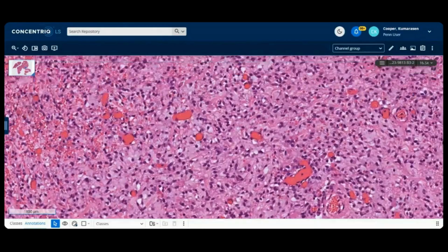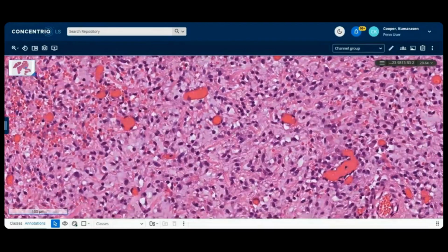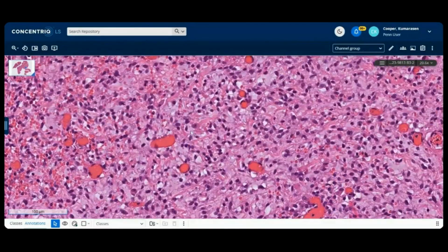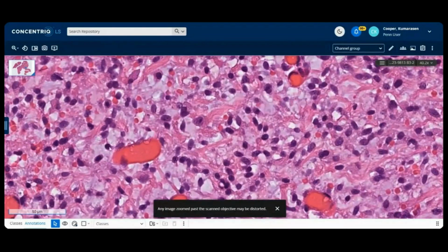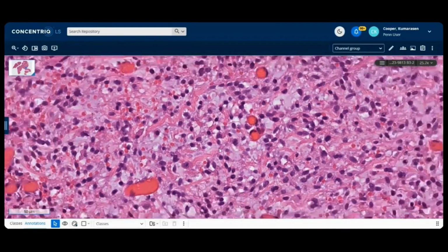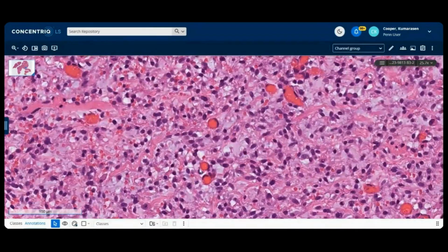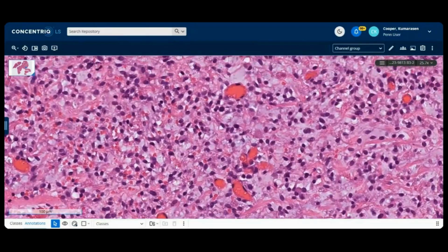And you can see the collagen component, almost crisscrossed, in the background. And this does have some myxoid matrix as well. Now you can see the myxoid here. It's this gray, bluish material, which is what I like to see to label myxoid material. Pretty similar throughout. This is what the tumor looked like. He had about three to four recurrences, and this is what it always looked like.